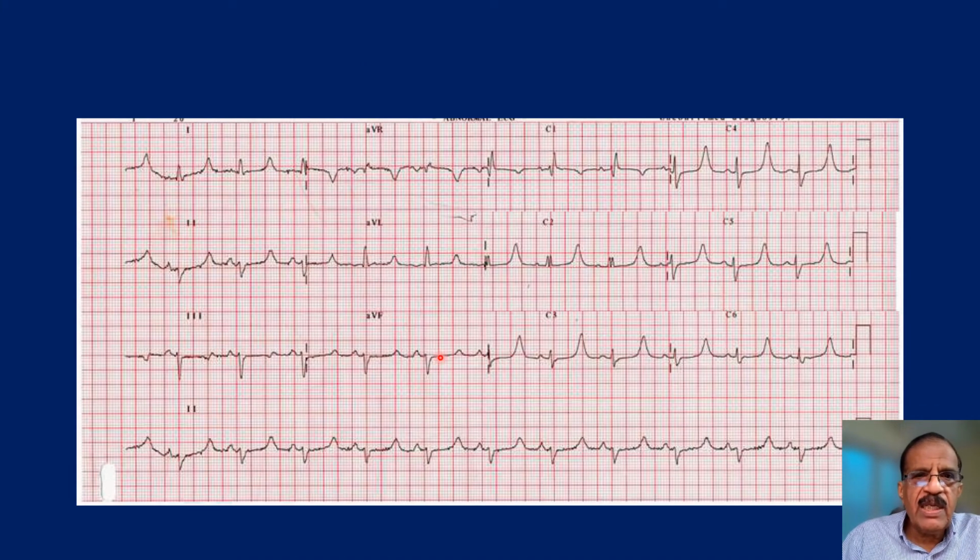Now we are getting to the end of this, and what do you see here? What is your observation? T wave is tall, like you had in hyperkalemia. We have already covered that possibility. Now there is some other electrolyte abnormality.